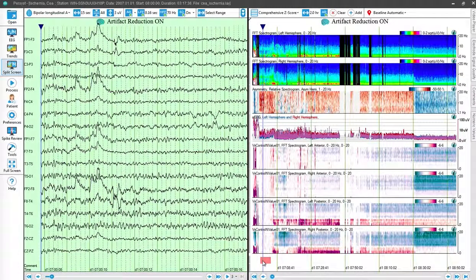What it does is it's a normalized z-score. It's essentially saying, all right, whatever the frequency distribution of frequencies and amplitudes at this particular marked range of EEG, that'll create a baseline that will calculate z-scores that is unique to that baseline to mark for the patient. So if we create a different baseline, those z-scores will be different because we're comparing to a new empirical null.